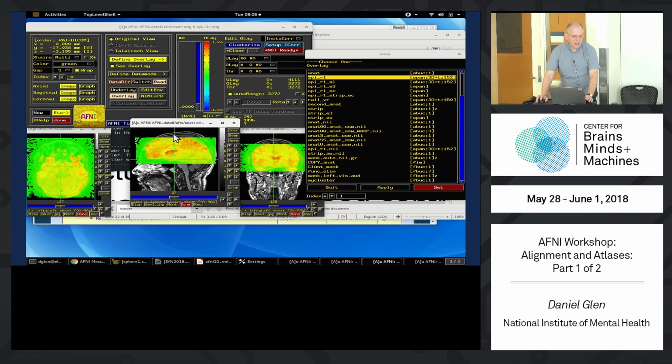Okay, and on any image viewer, you can click the 4 key, and you see that you get this kind of slider at the top. And you can drag that back and forth. So that's with the 4 key. The 4 key brings up that slider. If you hit any other number, or the 4 again, you can turn that off.